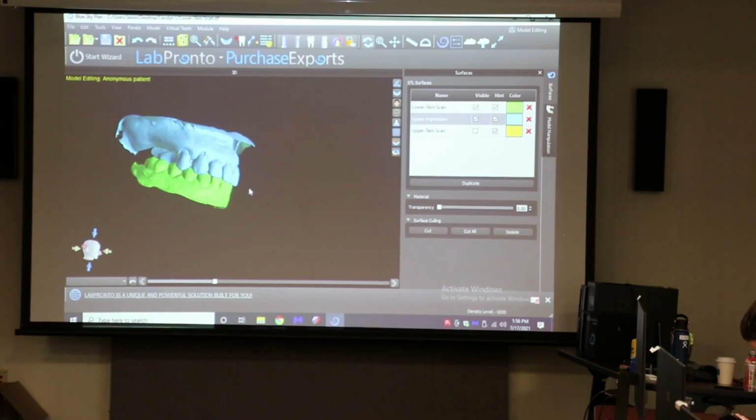That's so awful. That's so funny. Like an automatic. I know. Because it'll do it to DICOM so easy. I know. And you're like, oh, just match it to the yellow. I thought for sure you were just going to go in there and have all the teeth and all the references and just go, oh, okay. I know. Funny. It is funny. And if you did automatic, what would it say? Can't do it?